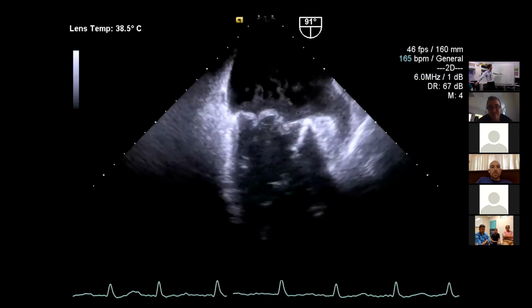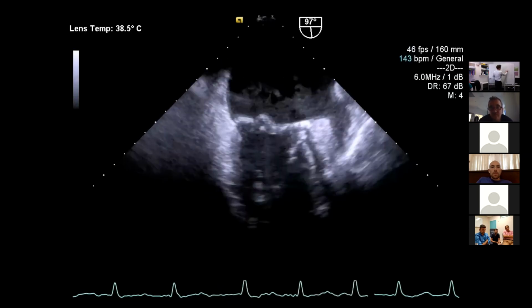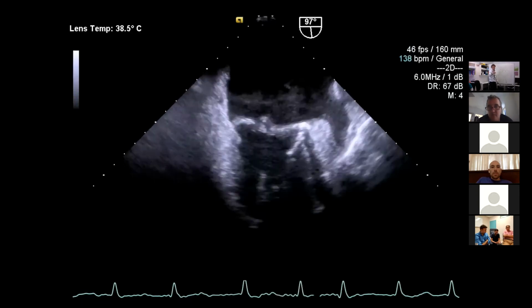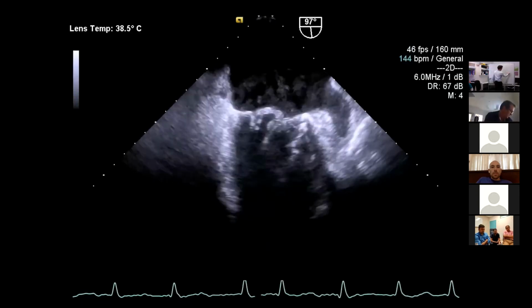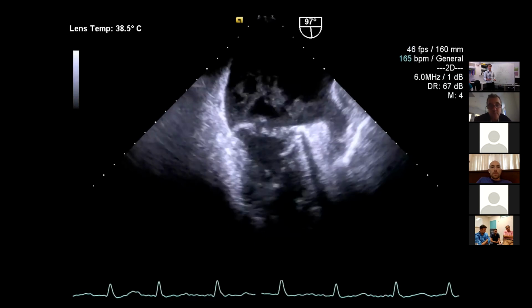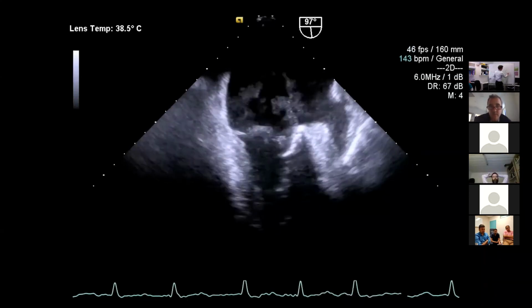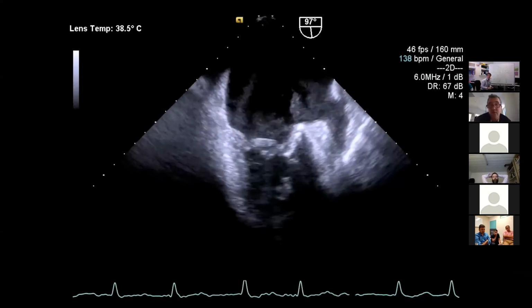There's got to be a hole in there. So you'd be seeing P3, A2, P1. Whereas in this one, right at the end, it all looks connected. And that tells me it's the P2 that's predominantly affected. And I think it's both of those two that are affected. Yeah?